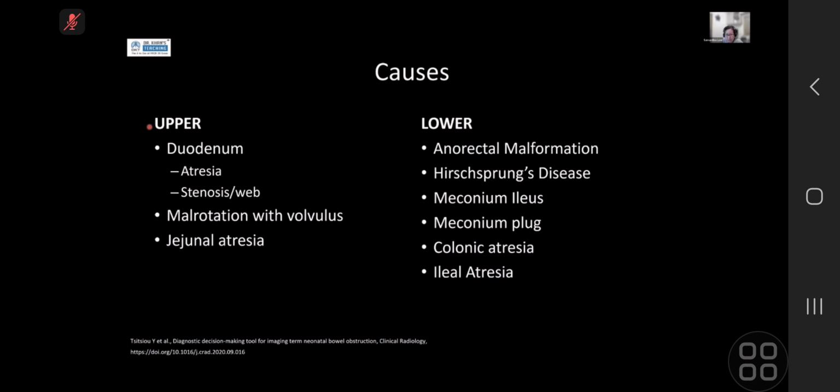So please repeat ileal atresia. On fluoroscopy, you see a very similar appearance in ileal atresia as in meconium ileus, where you get total colonic microcolon. The difference between one and the other is hard to tell unless you can see meconium within your terminal ileum.